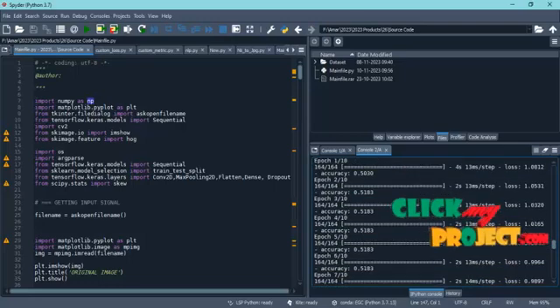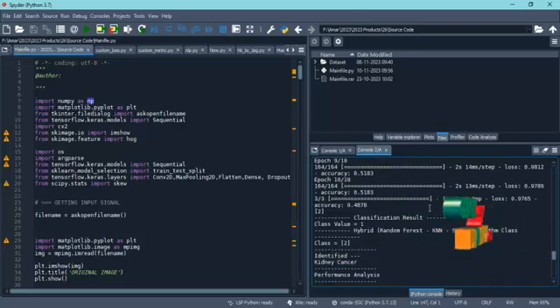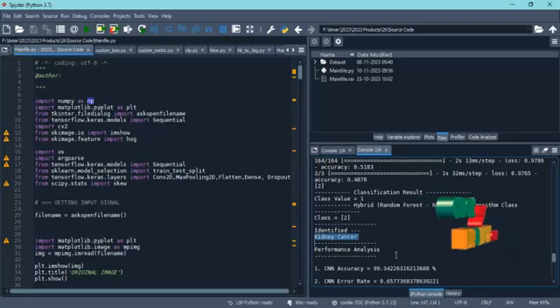After doing the epochs, we have to estimate which type of cancer this is. In this process we have applied machine learning and deep learning to identify which kind of cancer this is. We have imported the kidney image, so this belongs to kidney type of feature extraction and kidney type of classification. So kidney type of cancer is shown here.